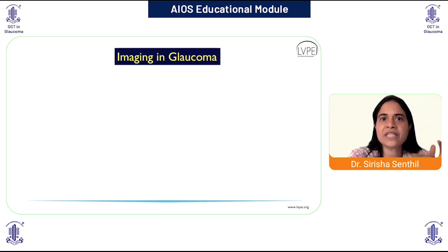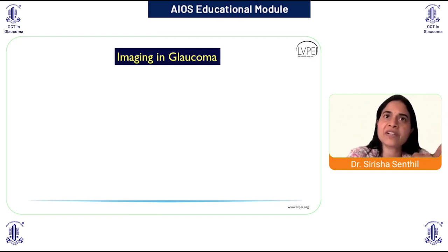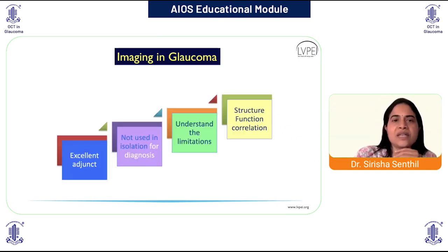In early defects, before we call it pre-perimetric, we do an OCT, but if you're seeing a defect which you're not able to clinically correlate or not finding on an HVF, always remember to do a 10-2. Unless you do not have a defect even on a 10-2, you will not call it pre-perimetric glaucoma. So that is in gist.